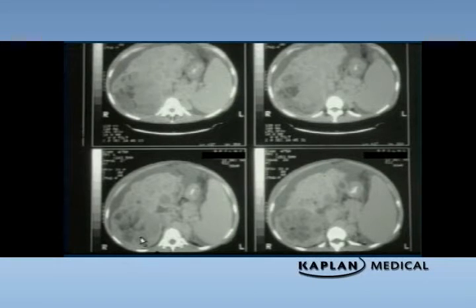This is a hepatoma and multiple abscesses. This is effusion. This dark stuff here is ascites. And when you have effusion in the abdominal cavity, it's ascites. So the dark stuff is fluid. Now, you might say, well, why isn't the fluid gone to the back? Because it can't get there.